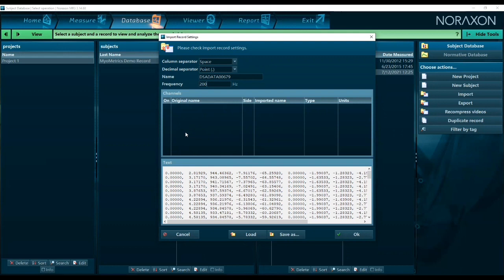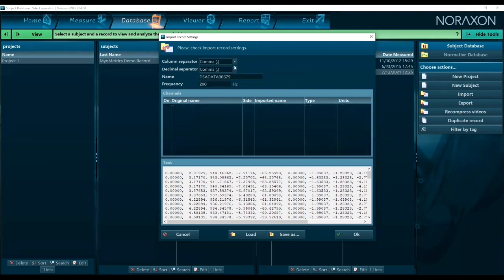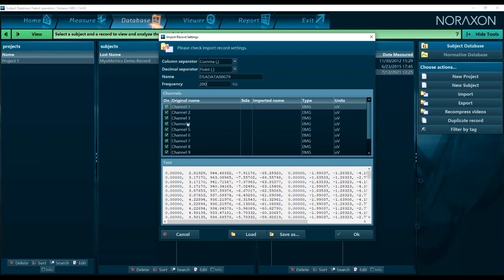So what we'll do is we see our data here, okay? We're going to go here and click separate with a comma, and that's going to bring up our different channels. If that didn't work, you can also play around with this here. But the main goal is just to get it to where it can interpret that there are 12 channels, and that's how we can assure that we're doing what we're supposed to do.